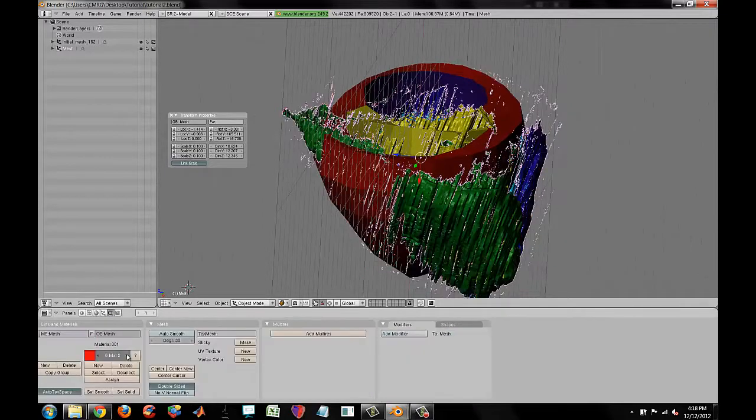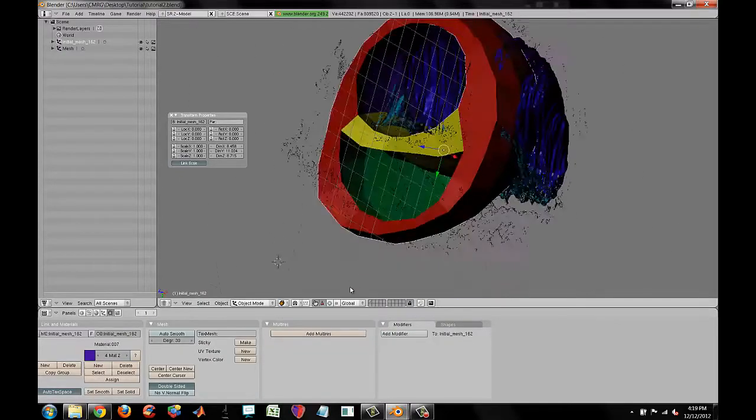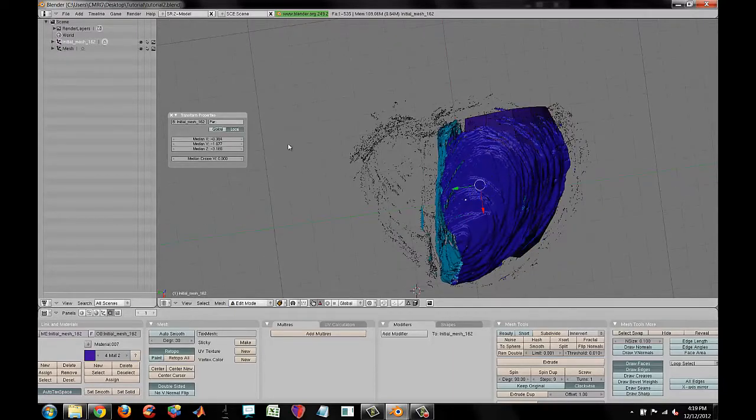The left ventricle is the most critical part. You have to match the apex of the data with the left ventricle. You do that through the left ventricle apex. What is tricky here is that the rest of the geometry still has to match approximately.